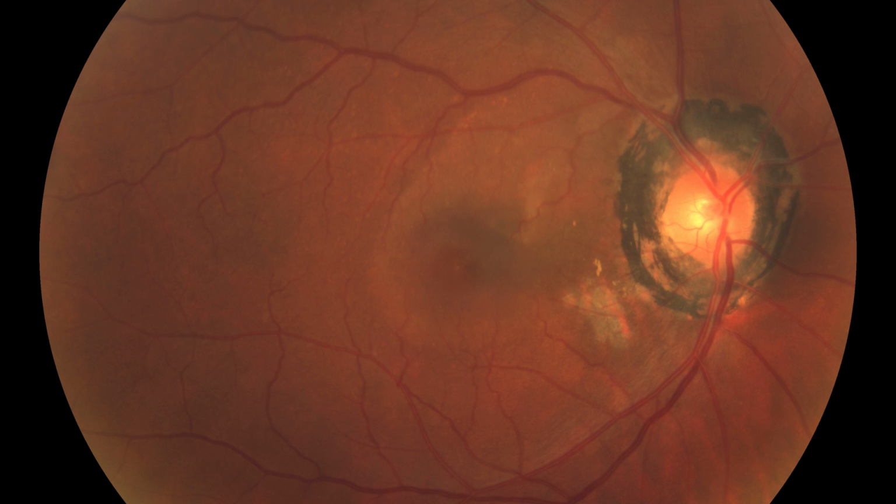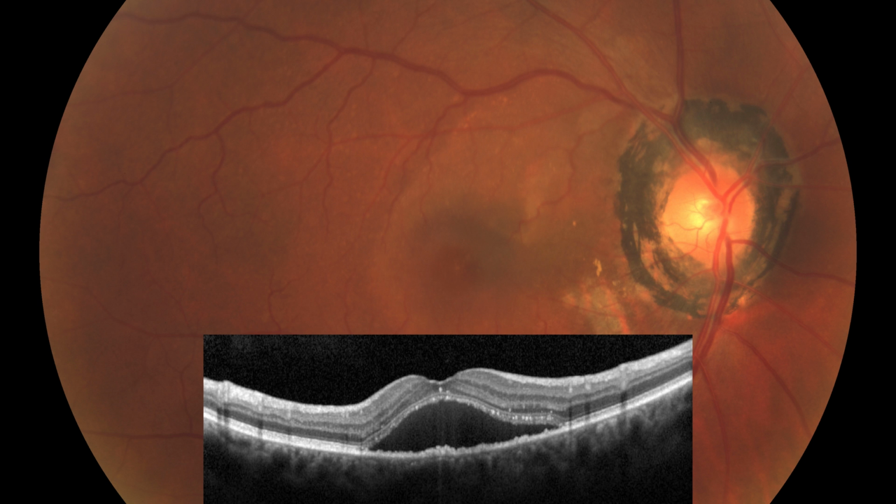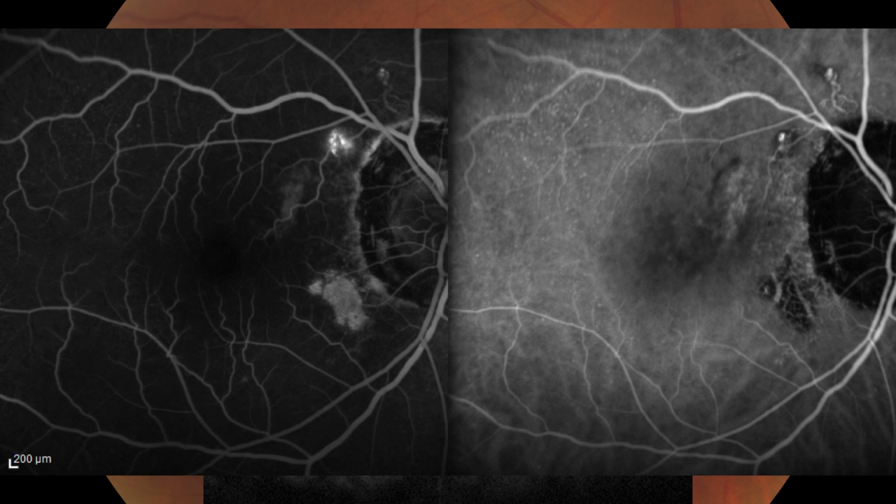This is another patient. This can be confused with central serous. All of these can, but this is one that gets a little closer to home. This is a primarily choroidal process as well, and you can see the blister of subretinal fluid. You could see on the OCT subretinal fluid there as well. You can also see this pigmented peripapillary atrophy and some RPE changes close to the nerve. On fluorescein and ICG, there is an area of leakage, hyperfluorescence, superior temporal to the optic nerve, as well as this sort of fine vascular network consistent with polyps that's seen both on the FA and the ICG.